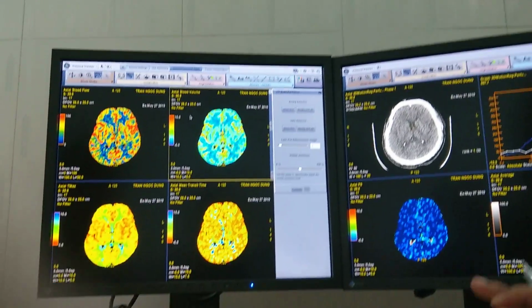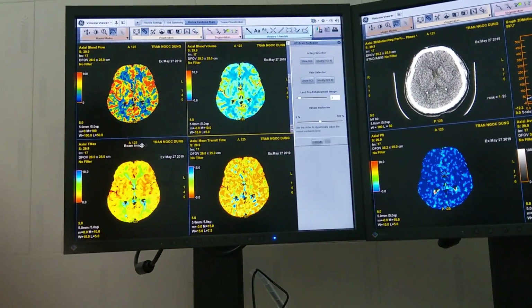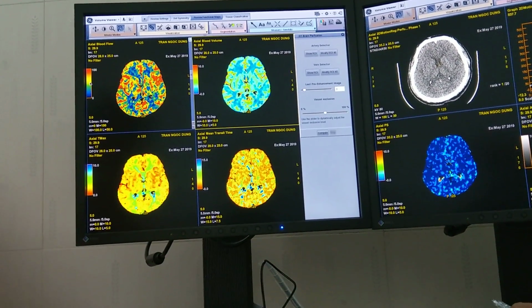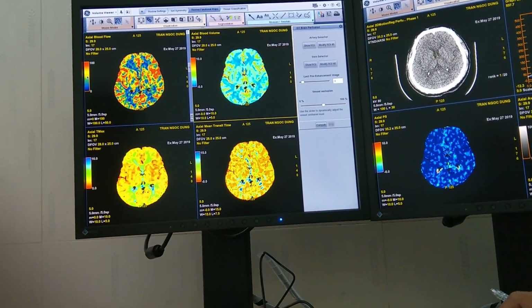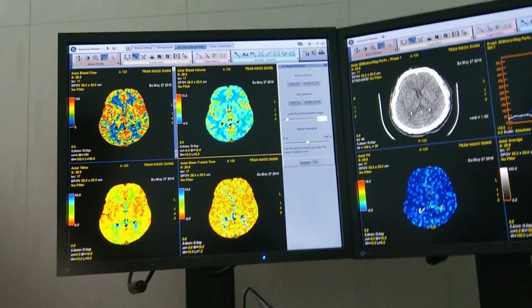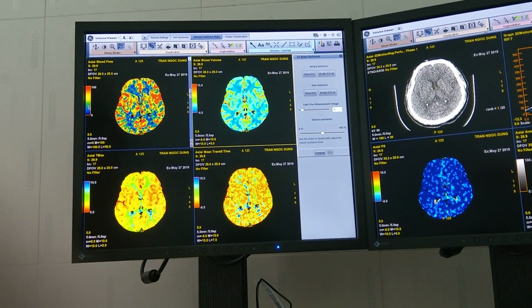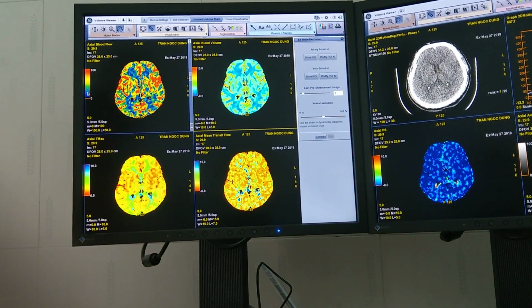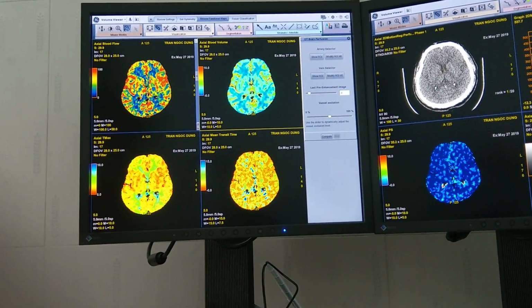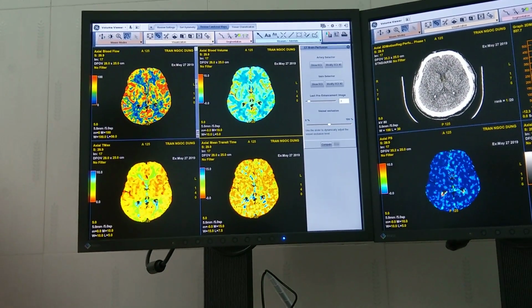Okay. There are many papers saying about the value. Some say if the color is less than 60% for blood flow, for white matter or gray matter, it is considered infarct. So anything blue, green is infarct. Consider this the absolute value, but we don't use absolute value. We compare side by side.